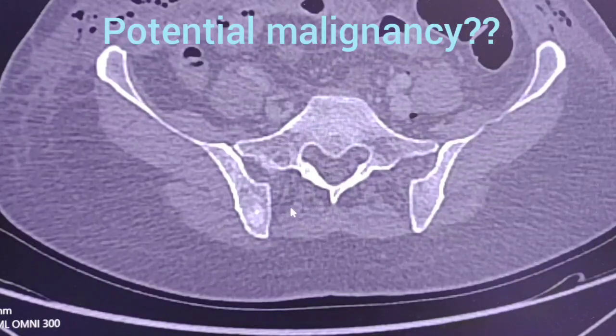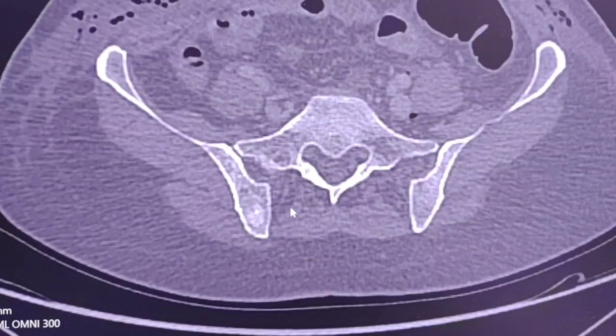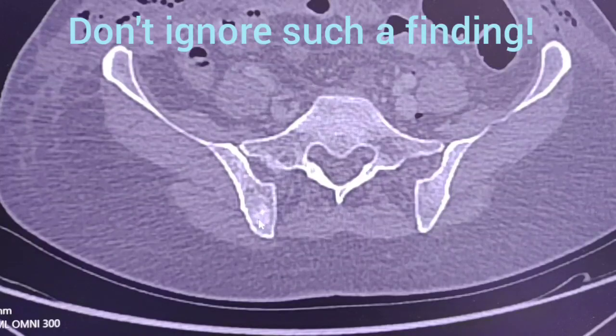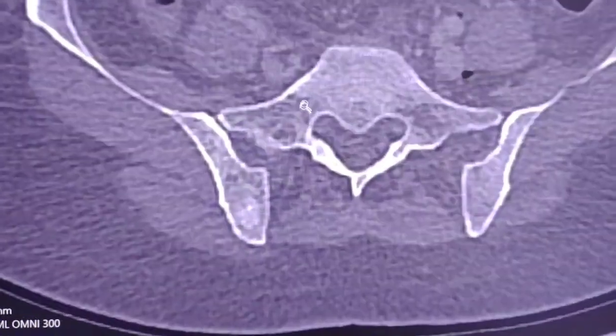Dear friends, hi. This is a case of a 51-year-old woman who presented with abdominal pain after a surgery, and as an incidental finding, I noticed this hyperdense focus in the posterior aspect of the right iliac bone, and I would like to discuss it with you.